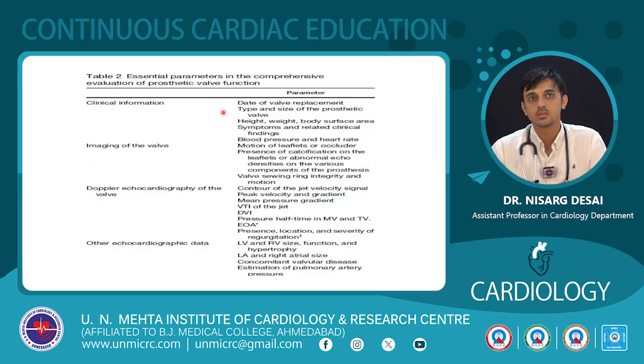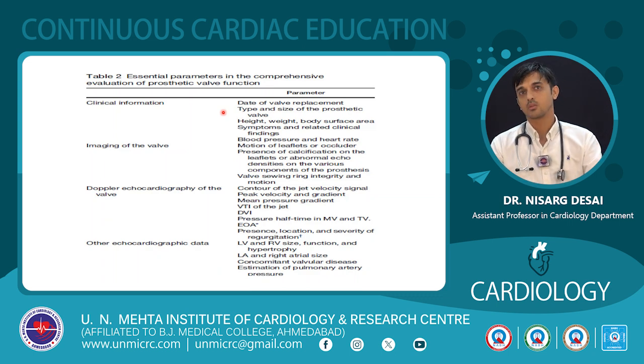This can be seen using just the screening echo, as well as whether there is any valve dehiscence. Dehiscence refers to the separation of the leaflet of the valve sewing ring from the native annulus. If it is an aortic annulus, whether the sewing ring has got detached from the annulus, and whether there is a loss of integrity between them. So those aspects can be evaluated just by using the screening and not the Doppler parameters.